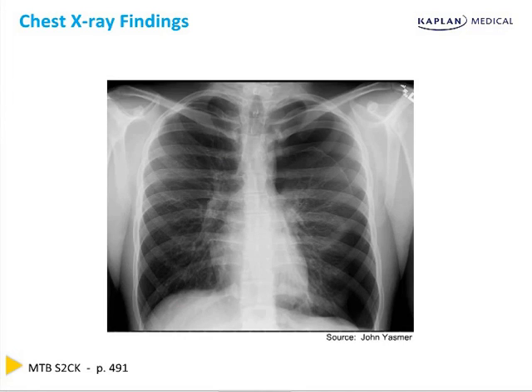Another classic condition that can be diagnosed via chest x-ray is a pneumothorax, or a so-called collapsed lung. Note the white line that is depicted by the arrows on this chest x-ray. This is actually the border of the left lung, which is usually found all the way out at the edge of the thoracic cavity. Due to trauma or a ruptured bleb, the vacuum between the visceral and parietal pleura of the lungs has been disrupted, which causes the lungs to collapse inward.